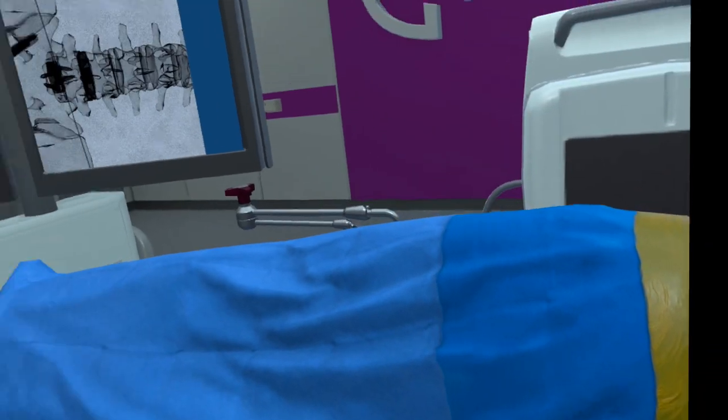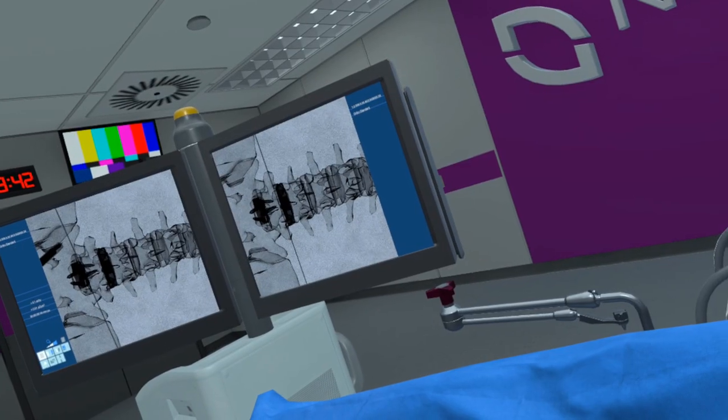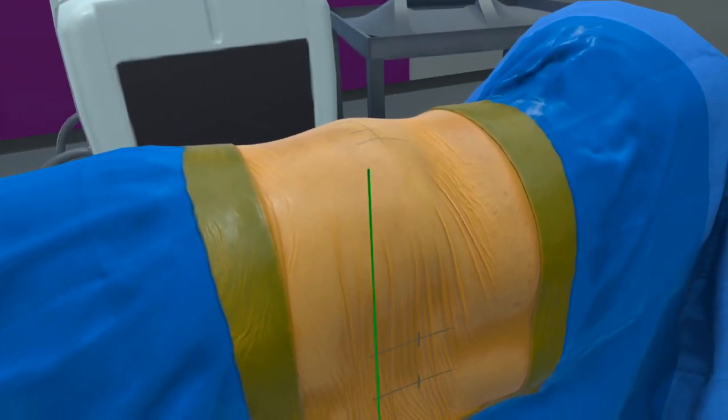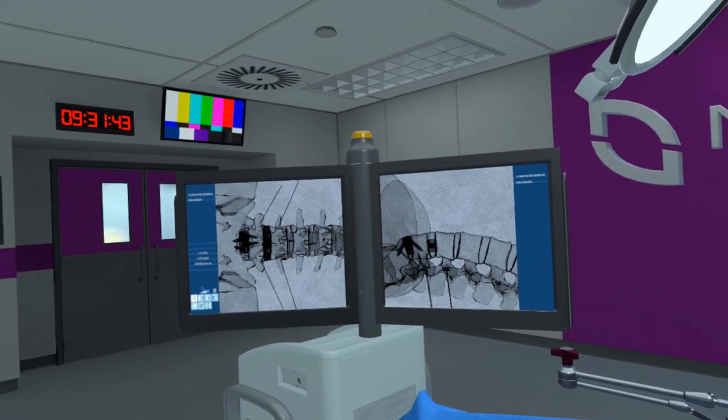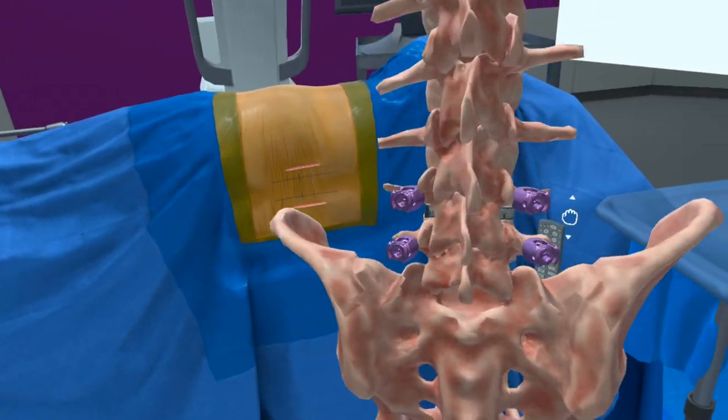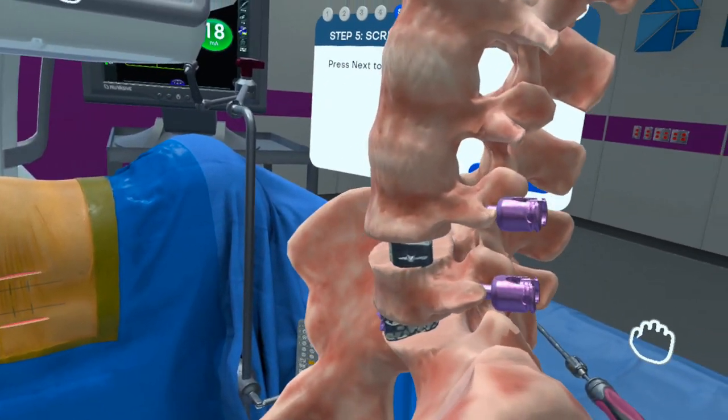Now, I'm showcasing here that you can make mistakes, and you can take C-arm images that are inappropriate or poorly aligned. Ultimately, what we want users to work towards is proper procedure, placement, and positioning so their pedicle screws will look closer to something like this in real life.